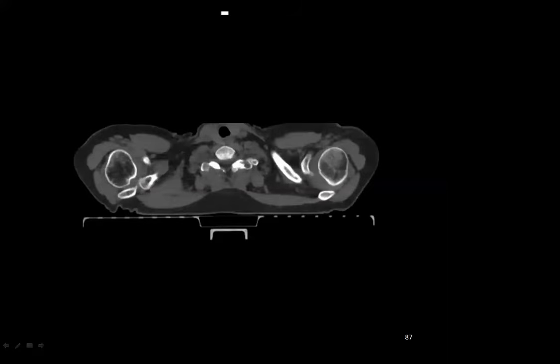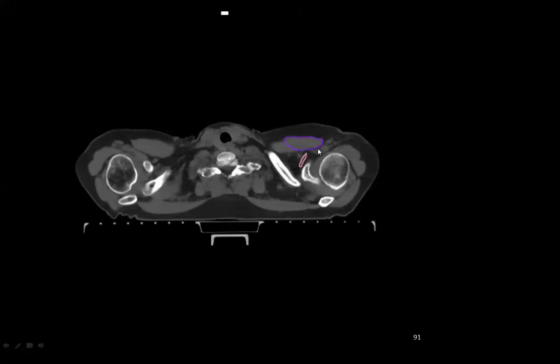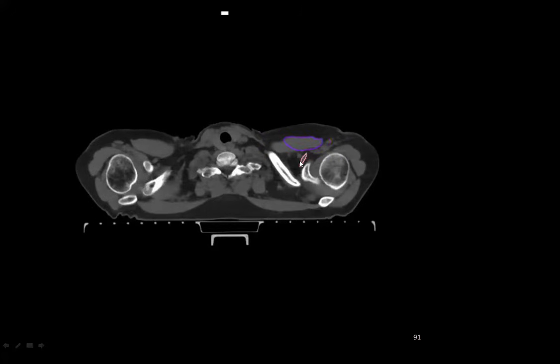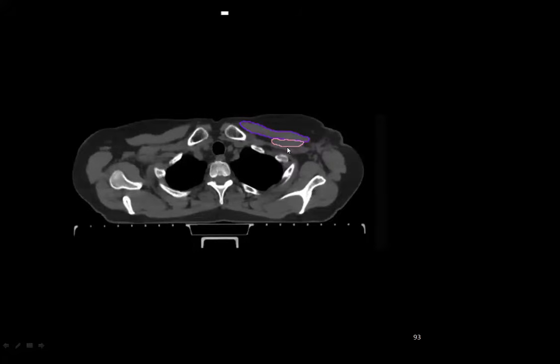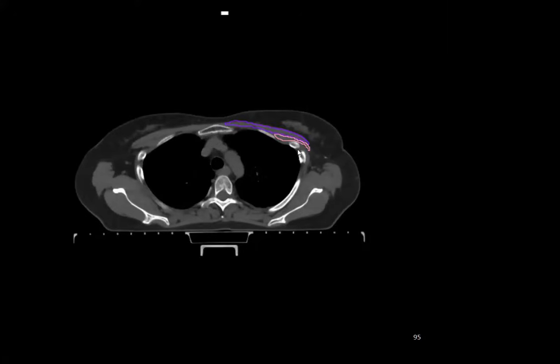So there are two muscles, as I told, pectoralis major muscle and pectoralis minor muscle. These are two muscles you can see here. This is the origin at the coracoid process of the scapula, where the pectoralis minor muscle originates. This is the pectoralis major muscle. You can go down, you can see how this pectoralis minor muscle becomes horizontal here. This is the pectoralis major, this is the minor. Again, go down. Around the third and fourth rib, the pectoralis minor muscle disappears or inserts into the ribs.